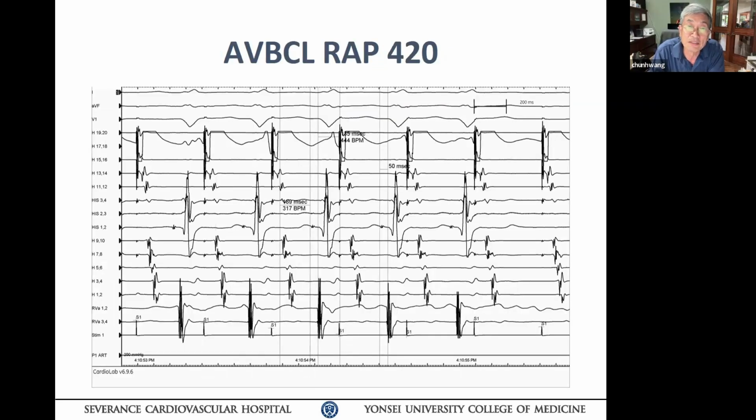So you did rapid right atrial pacing. What you see here is basically Wenckebach. You agree? Yes. So what's the HV now? Same. HV was still 50, yes. How can you argue, even though there's Wenckebach cycle, if it is a node ventricular pathway, AV node plus accessory pathway, am I correct? Yeah. Right? Then what would happen? Your blocked beat compared to the non-blocked beat, your HV should change.